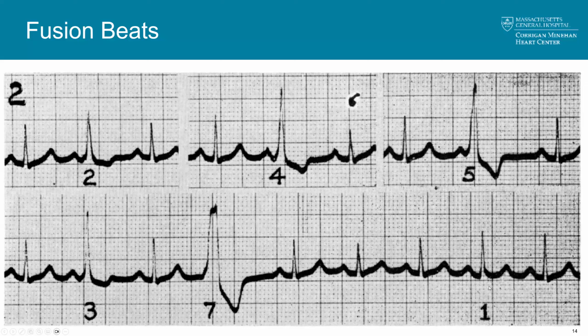And then you get down to number 1, where you've got maybe evidence of a PVC coming in just because that tail of the QRS complex is not exactly like it is in the adjoining sinus beats, meaning instead of that J point that's down at the isoelectric interval or even slightly below, you get this shoulder, right, that's just above. But aside from that, the rest of the QRS complex, axis, height, width, etc., is effectively identical to that of the adjoining beats. And so this is one where the supraventricular conduction won, so to speak, and number 7 is where the ventricular conduction won.